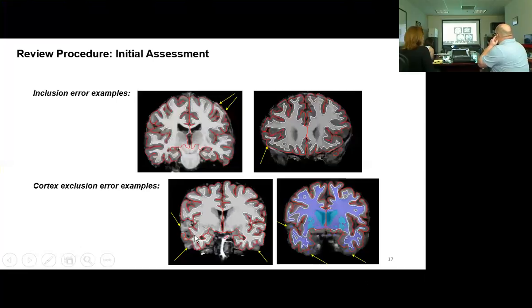So in this area, what you notice is that this gray here looks like a pretty good match to the intensity throughout the brain right down here. But then this gray is really dark, and this gray is really dark, and then this gray is really dark. And for whatever reason, FreeSurfer is not labeling these bits as white matter, and all this gets chopped off. So we want to correct that.